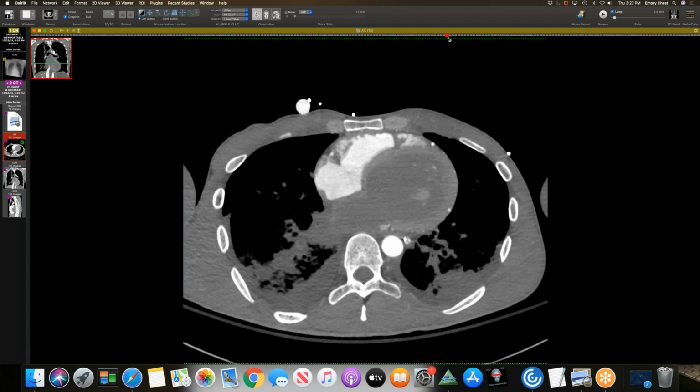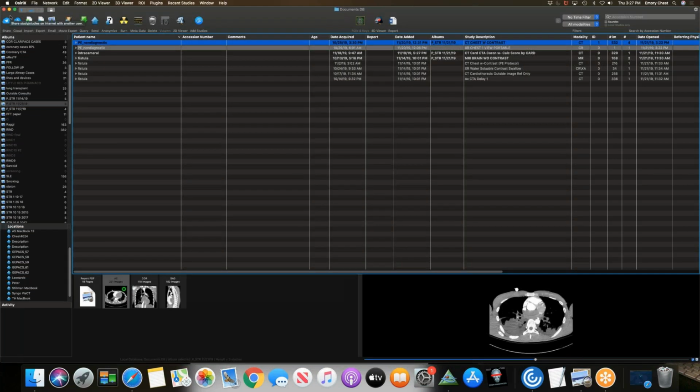Yeah. Interesting. Yeah, Howard, I'll have to look back and find your case. I think I might have missed that day that you showed. Yeah, the reason I showed it is because the metallic portion of the left ventricular vent, and it's small, can show up on an image, and then you don't know what it is. When I first saw it, I had no idea what it was.